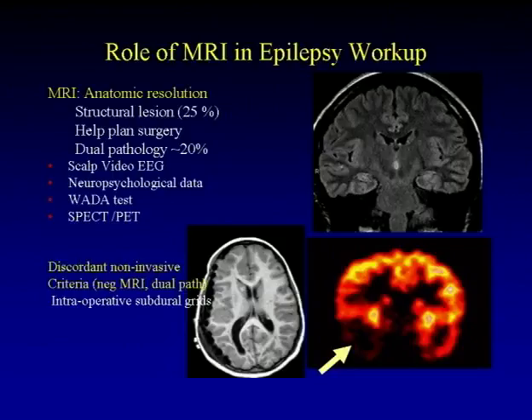And on occasion, we may see depth electrodes protruding into the brain parenchyma to help pinpoint where the seizure focus is, because the surgeons never want to take out an area of a brain unless they're fairly confident that the seizures are arising from that area.